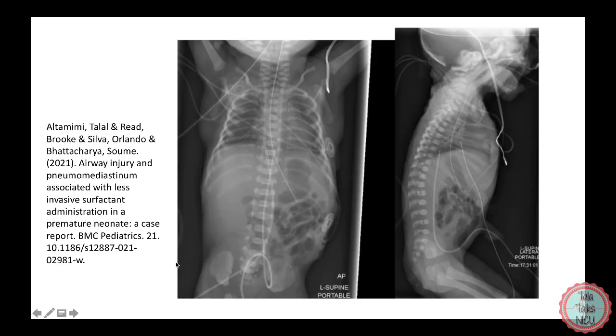And here we have two examples of AP and lateral x-rays. In fact, these ones we actually call babygrams because they've basically captured a lot of the baby. Here, the lateral x-ray was helpful in checking the line positioning.